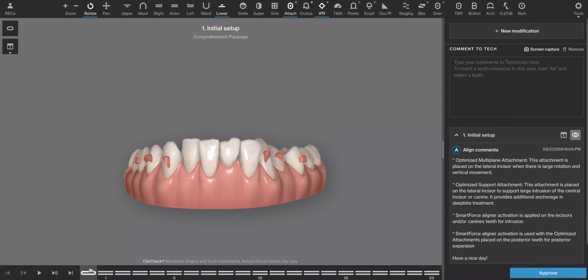Intruding lower anterior teeth like this, there's something called relative intrusion. When you go to straighten these teeth, they are going to tip. It would be wonderful if we could say every time we move a tooth according to the plan that we get 100% bodily movement in the expected direction compared to the computer model. The reality is we're going to get some tipping here. When you get tipping, the teeth will, in essence, look like they've dropped down or intruded. That's not actual intrusion, that's relative intrusion.